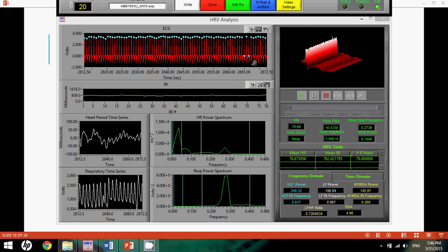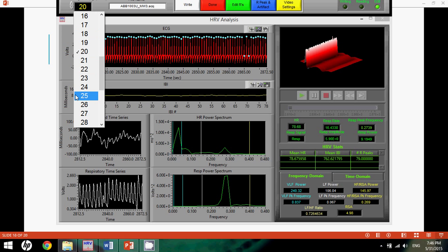And in this circumstance, it's perfectly okay to have two mid beats in one segment, just because they're not consecutively next to each other, and they have that gap, or they have that real spike in the middle. So this is a salvageable segment. We'll go ahead and take a look at the next segment of interest.